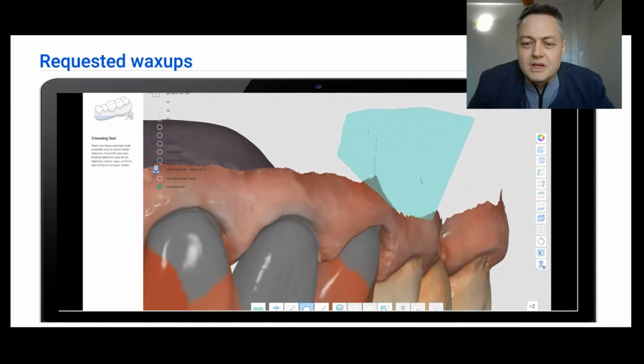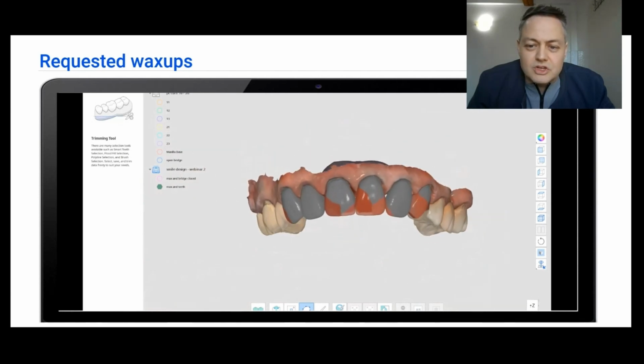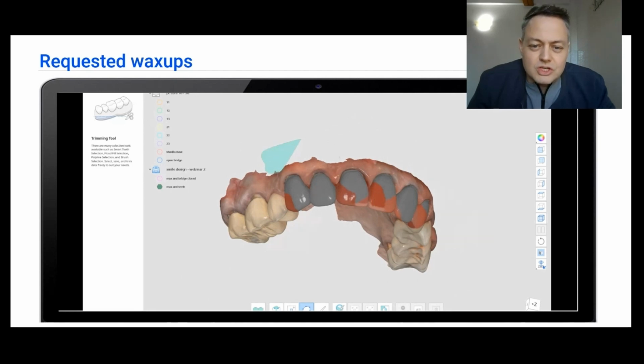When these things are done, some little errors can go into your models, and this happens at the edges of the models. Just zoom to the edges, and if you see errors, just select these areas and cut them out, as you can see in the video.